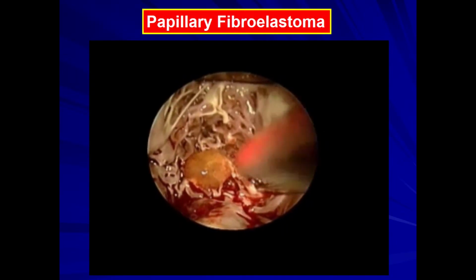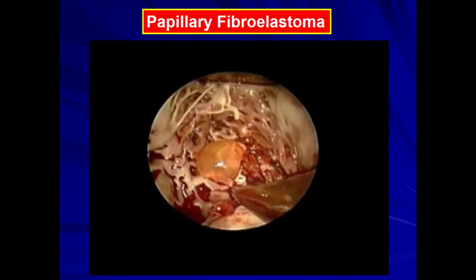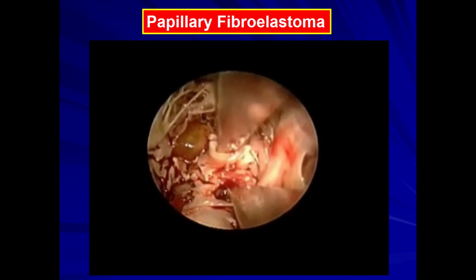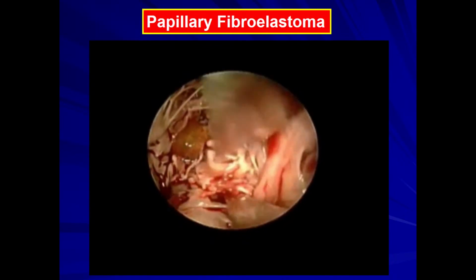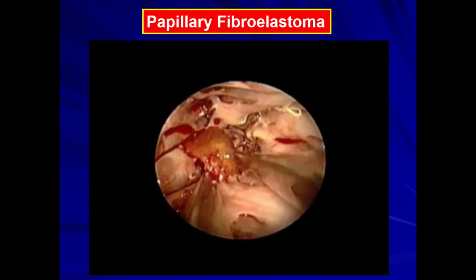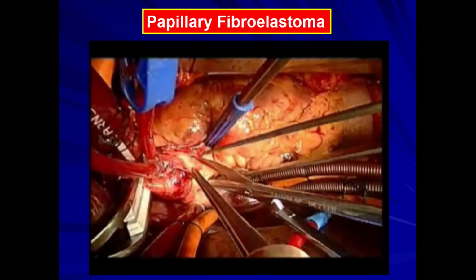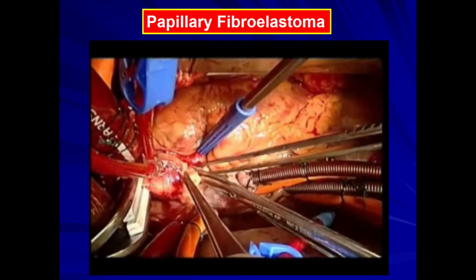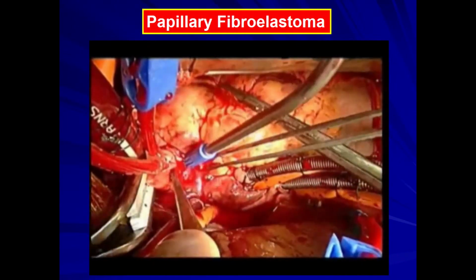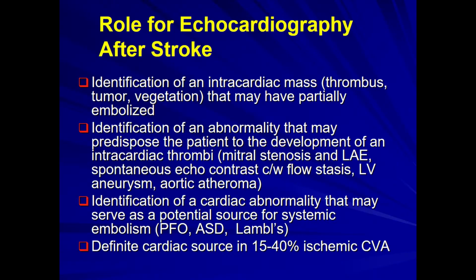So this mass was sent on to pathology because, again, it was a very, very unusual location for this. And this turned out to be a papillary fibroelastoma. These usually occur on the high flow side of valves, sometimes chordae. Very unusual for it to be stuck to the trabeculae, like in this particular case, and that was the reason for the removal. There is some concern about embolization with papillary fibroelastomas, but you could see that this one was very tightly adherent, so the likelihood of that would have been extremely low.